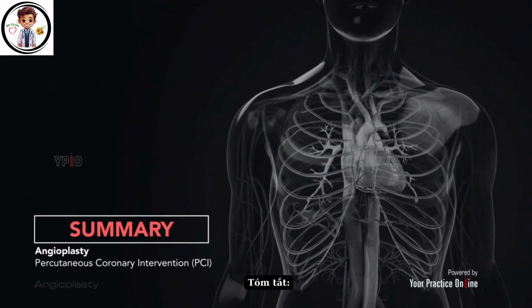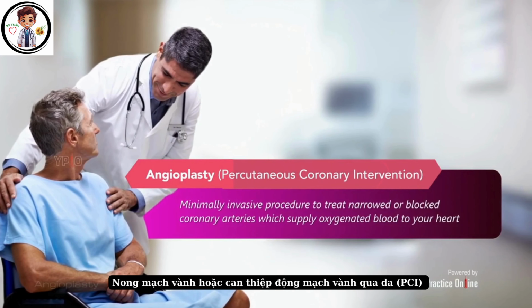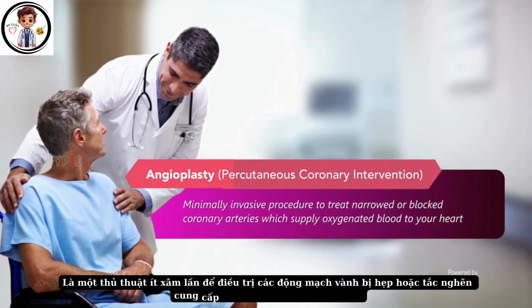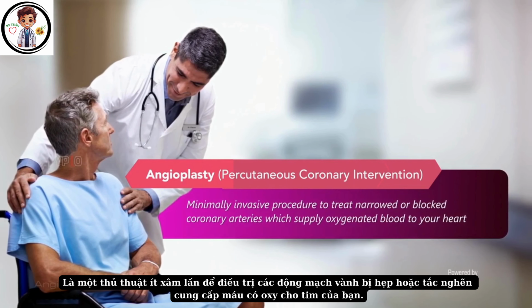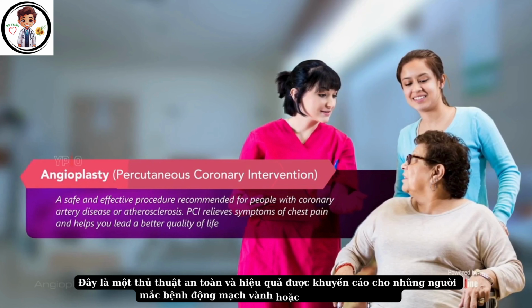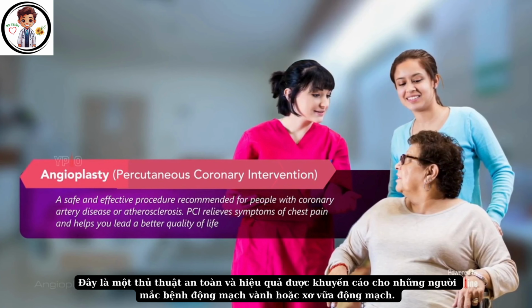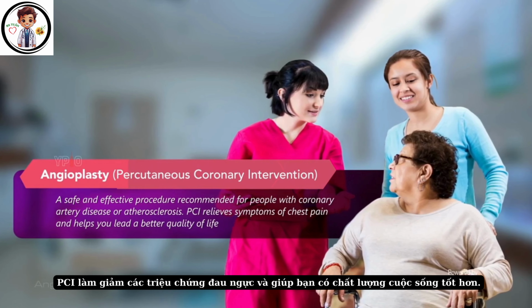Summary. Coronary angioplasty or percutaneous coronary intervention, PCI, is a minimally invasive procedure to treat narrowed or blocked coronary arteries which supply oxygenated blood to your heart. It is a safe and effective procedure recommended for people with coronary artery disease or atherosclerosis. PCI relieves symptoms of chest pain and helps you lead a better quality of life.